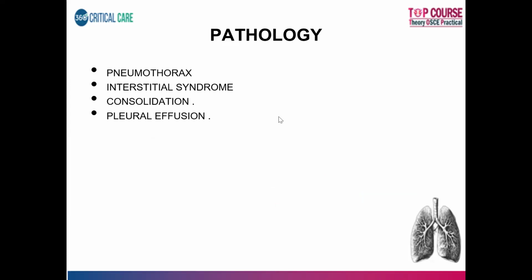So coming to the various pathologies, we have learned a few of the definitions and important image findings in lung ultrasound.